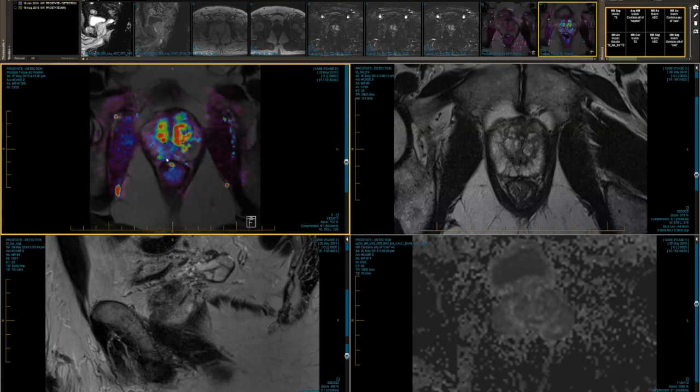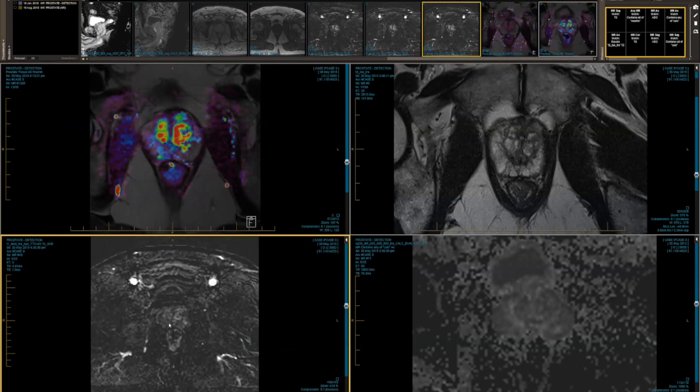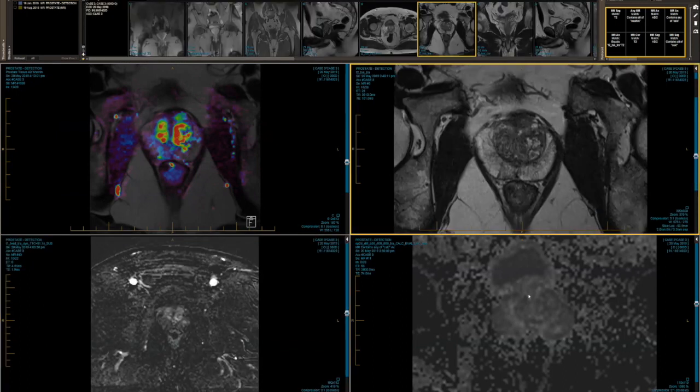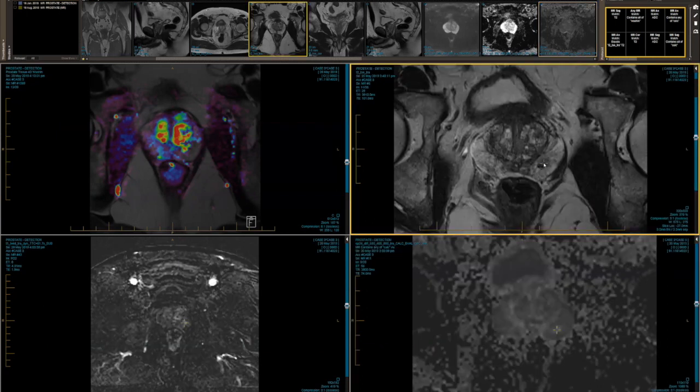So this is well, I could correlate to that on the axials, on the subtracted images, or on the T2s, or on the high b value. I must admit, I think that left side, I would definitely probably be a little concerned about. Yeah. I suppose I'm saying it's extremely linear on the T2s, but it does enhance with contrast. So I would call it a 2, but we'll see. Yeah. You always find those tiny little lesions that you see really well. Okay. Let's have a look.